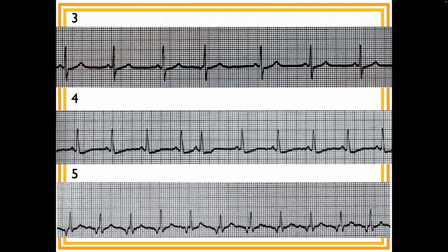And then we have one oddball beat. When you took your calipers to see if it was regular, how does this one line up with the others? Is it early? Is it late? It was early. It's not early by much, but it is early. Typically when there is a single early beat, it's a premature beat. It was easier about a half hour ago because we only had one kind of premature beat, but now we have PACs and we have PJCs.